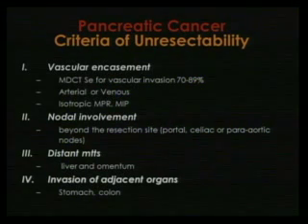Okay, I think that it's important to remember always what are the criteria of unresectability. Vascular encasement, that can be arterial or venous. I recommend you to use multiplanar reconstructions and MIP reconstructions to evaluate the vascular structures. We'll see this in detail.